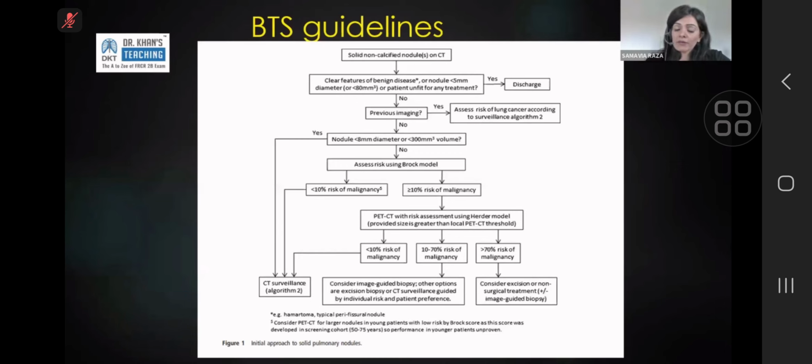The first question I get is, how do you measure a lung nodule? So it's the opposite of how you measure a lymph node. Lung nodules are measured in their largest diameter. So if it's an ill-defined or slightly ovoid or irregular nodule, you would measure it in the largest possible dimension. There is no right or wrong, because that number is just to give you an indication of probability of it being sinister, and what that number is giving you is something to follow up on.